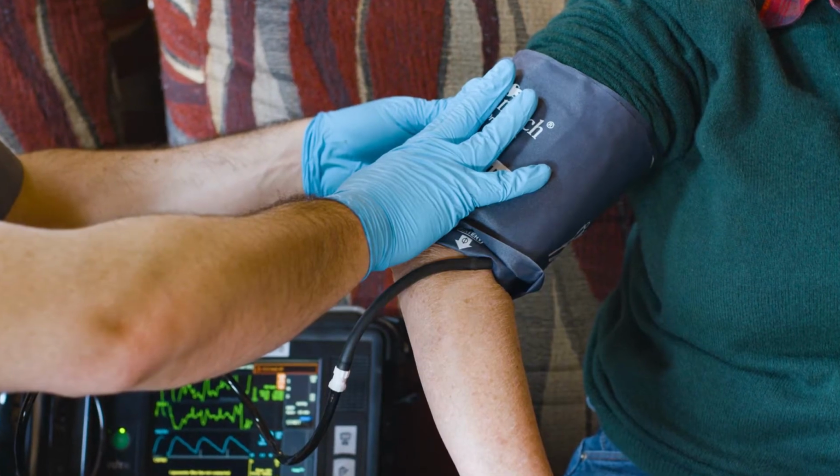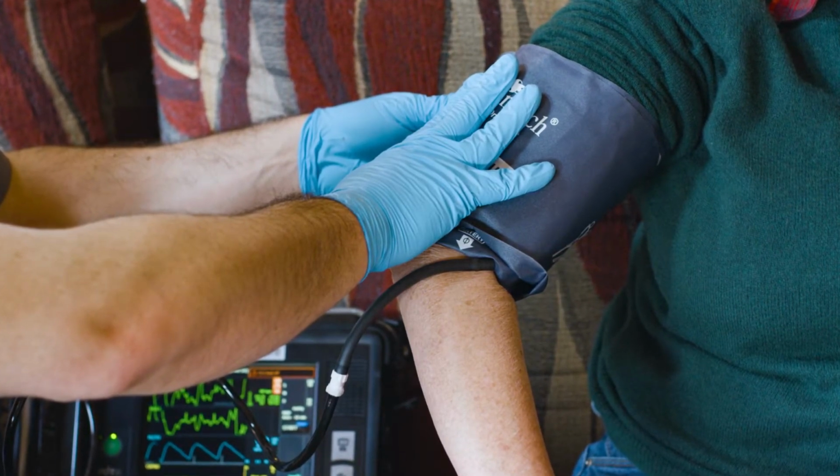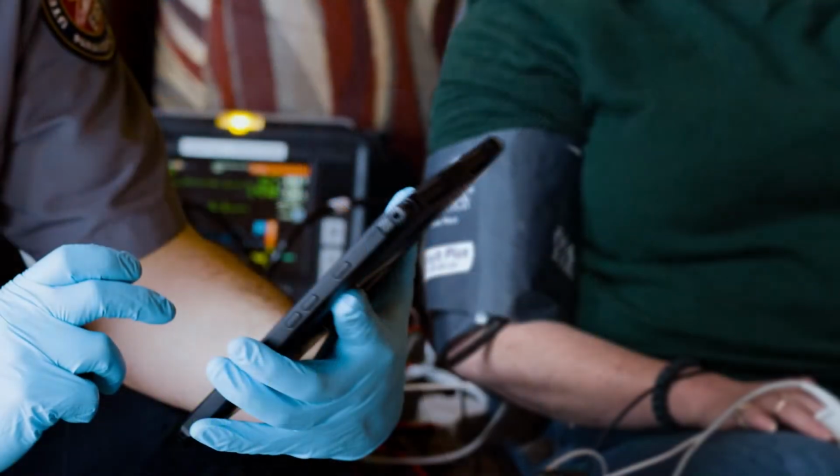So when we look at a demo, we want to show you 3 basic steps that will help you understand how to leverage Pulsara. So step 1 is you create a dedicated patient channel. Step 2, you can dynamically build your care team. And then step 3, you communicate. It's that simple. A first responder or medic can create a dedicated patient channel by simply entering the patient name.